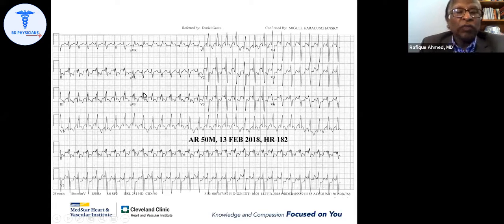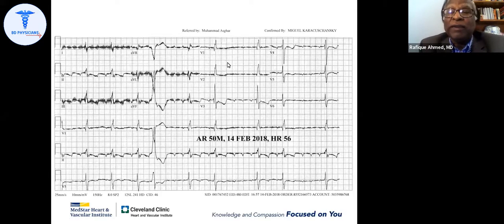So your diagnosis is supraventricular tachycardia, right? Yes, sir. With underlying right bundle branch block? Yes, sir. Why not ventricular tachycardia? It can be, right? Yes, because it is wide QRS. But when I give adenosine to this patient, you can see we block, and then still we have right bundle, and it was an atrial tachycardia that we could distinguish.